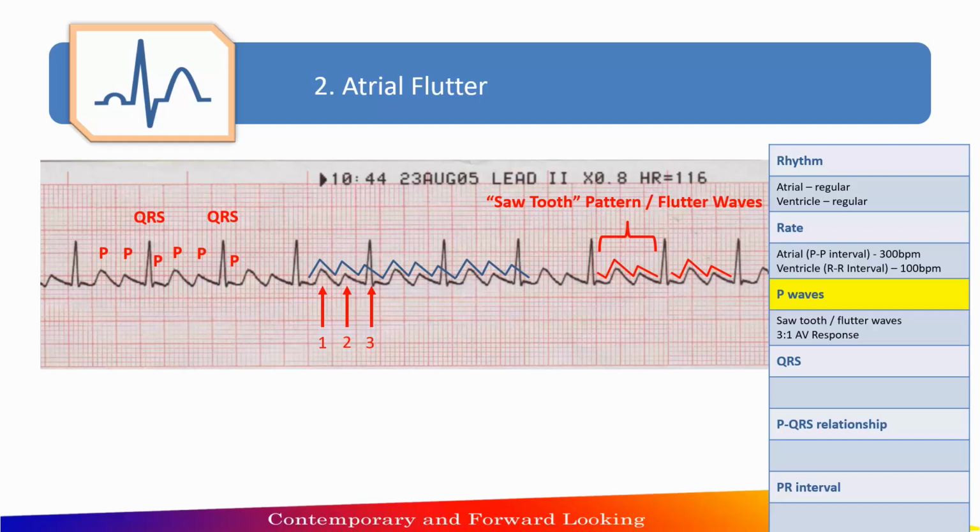It is sometimes tricky to identify the number of P waves present in an atrial flutter, as a P wave can become embedded or hidden within a QRS complex which has a greater amplitude, as seen here. You can see the remnants of a P wave embedded within the QRS because the QRS is a much bigger wave, i.e. higher amplitude. Earlier, I emphasized the need to measure both the atrial and ventricular rate in an atrial flutter. Well, this is where it will come in handy.